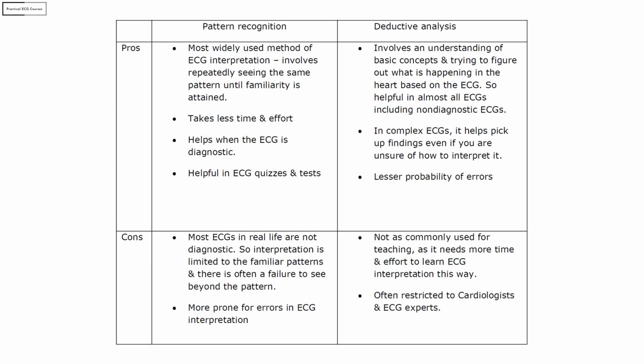When you use pattern recognition only to interpret ECGs, you see all the ECGs in terms of diagnosis because you know some diagnostic patterns and their criteria, and you are trying to fit the patterns in the ECG into one of those boxes of diagnosis. So when you have a pattern you are familiar with, you're fine. But when you have a pattern that you are not familiar with, then you struggle to interpret the ECG accurately and the ECG becomes non-diagnostic. Remember, most of the ECGs that we routinely see in the ED are non-diagnostic.